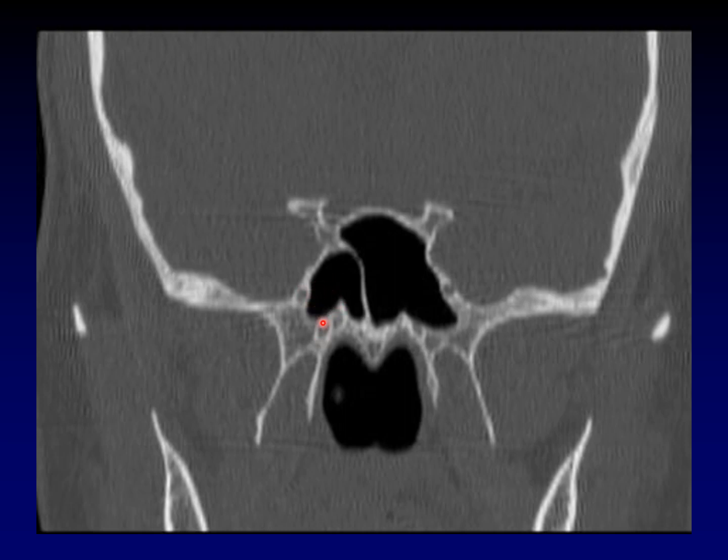The sphenoid sinuses have a variable relationship to these two structures. Sometimes they barely even reach these foramina. Sometimes the lateral recess of the sphenoid sinus will extend between them, and sometimes there's so much pneumatization of the sphenoid sinus that it looks like Vidian's canal is sitting on a little bony stalk floating in the middle of the sinus. All of those are normal variants on the sphenoid sinuses. But the teaching point here: foramen rotundum, Vidian's canal on this coronal image posterior to the pterygopalatine fossa.